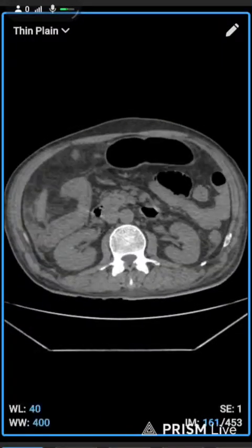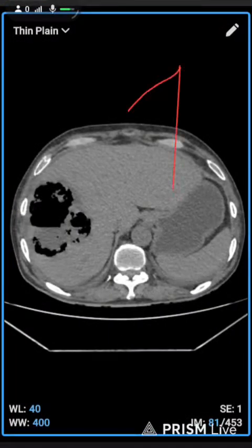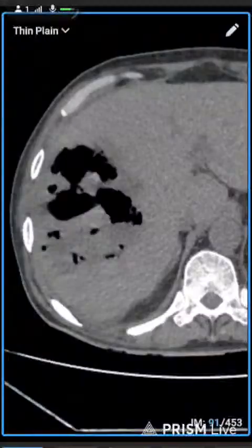So here is a plain scan of the patient. Here you can see a little bit of information in the plain scan. If there is a fluid, in X-ray you will find out on erect abdomen. It also means in erect abdomen we will see the water level of the cyst or the collection in this abdomen. So in erect position we will see the level of the fluid.